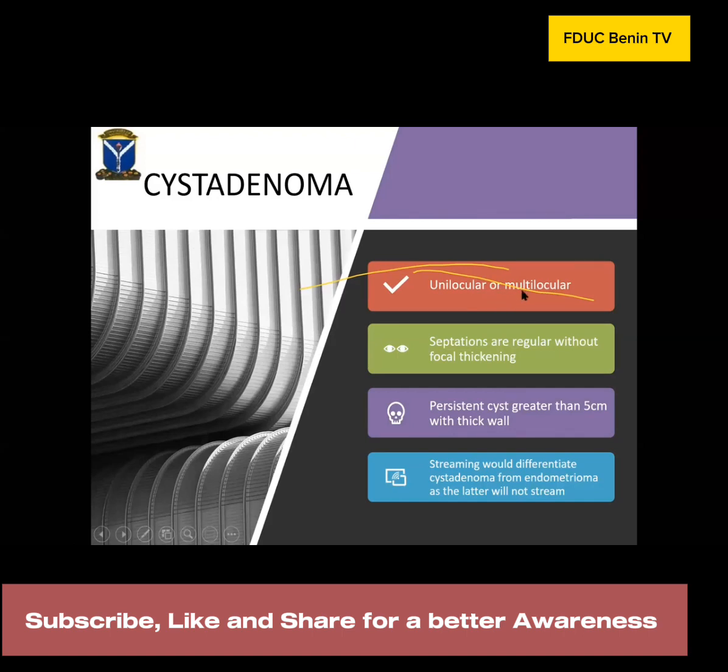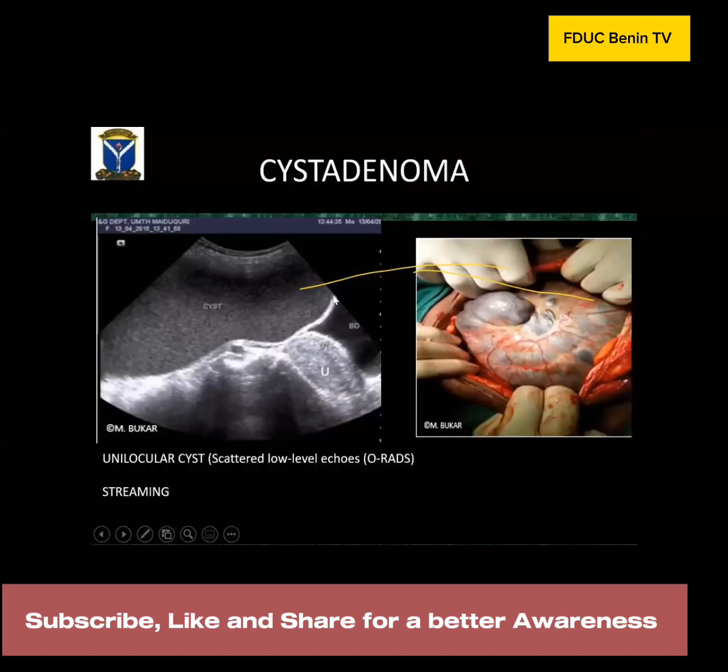Mucinous cyst adenoma are usually multilocular, and the contents are not usually clear. They have low-level echoes. The septations are regular with no focal thickening. This is a case of mucinous cyst adenoma.